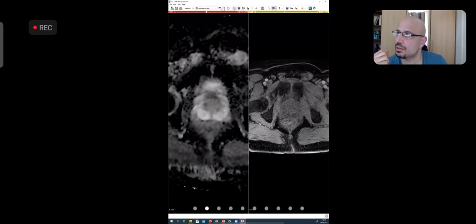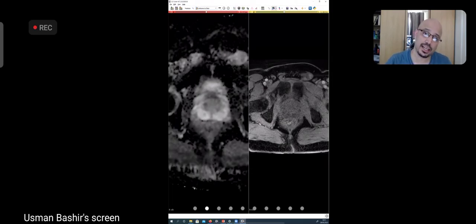And even if not, all you have to do is scroll through the images one series after the next. DCE, like I said, you acquire a new series every 13 to 20 seconds. On a good scanner, every 13 seconds you're acquiring. On a not so good scanner, every 18 seconds. Recommendations are, I think, not to delay more than 18 seconds, because you will miss that early blush of contrast that you're looking for.